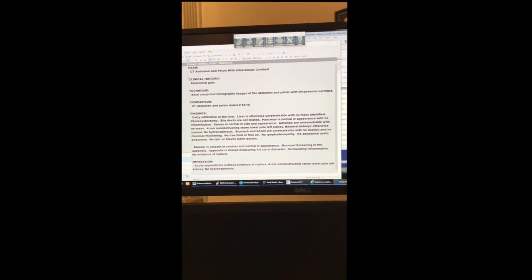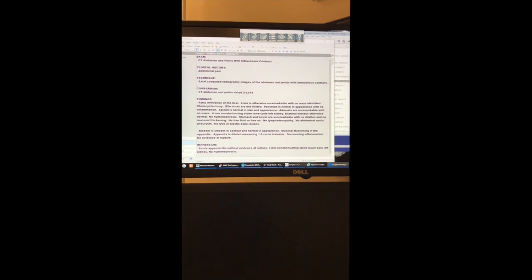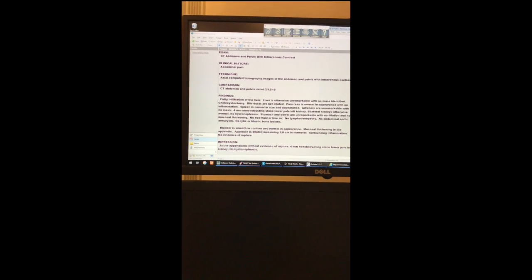I think once you see the features that are really available in rScriptor, you'll want to use it, and it makes your dictating even easier than in PowerScribe 360.